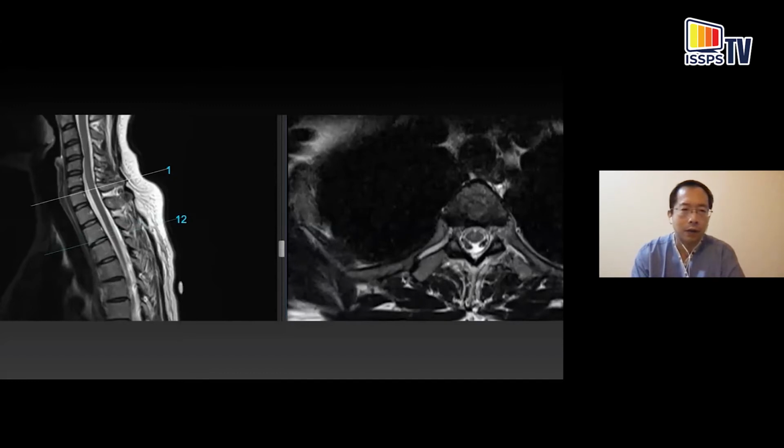You go back to the sagittal scan and make sure you don't see any big leash of vessels, because if you see large vessels in that area, then you're looking at a dural AVM of the dural space. So you have to be very careful about that. If you just see these dark areas alone, and you don't see them on the sagittal, it should be okay. Or otherwise, just call up your friendly radiologist.